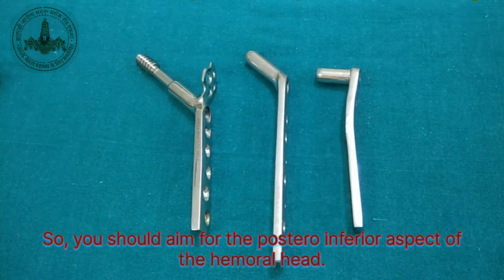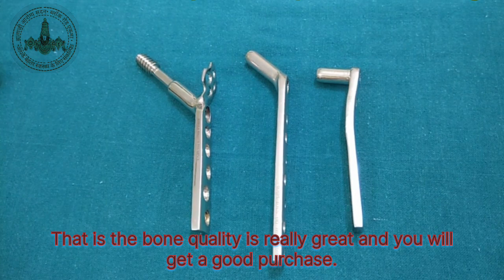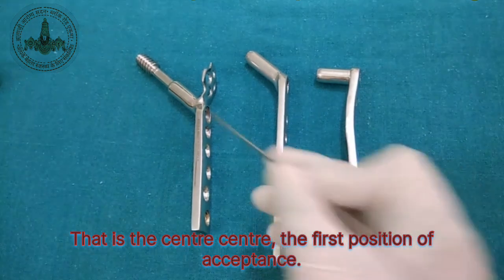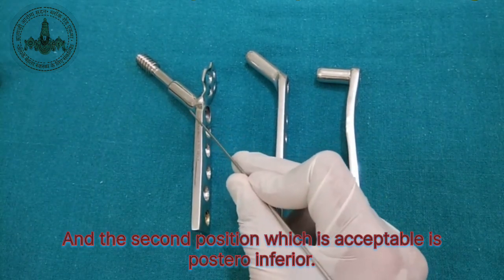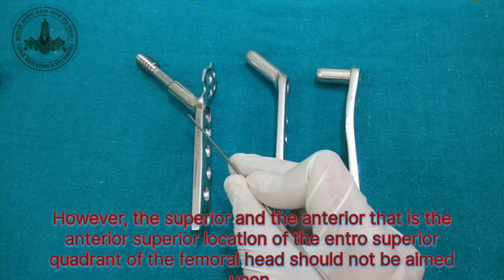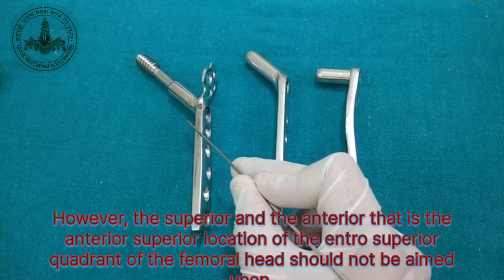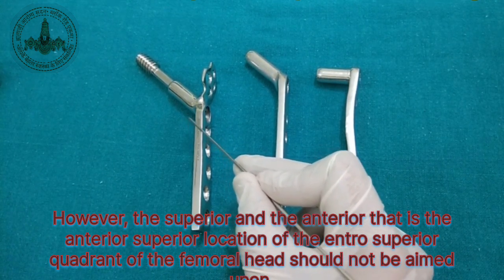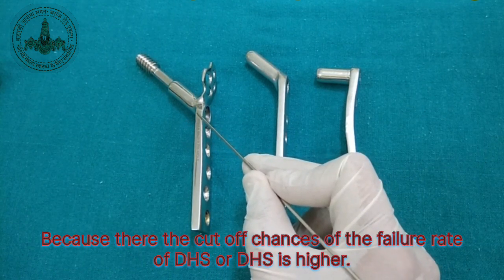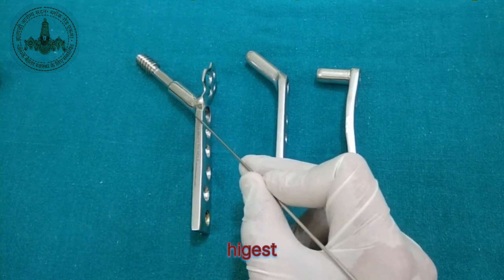So you should aim for the posterior-inferior aspect of the femoral head, where the bone quality is very good and you will get good purchase. So center is the first position of acceptance, and the second acceptable position is posterior-inferior. However, the anterior-superior quadrant of the femoral head should not be aimed at, because there the cutout chances, the failure rate of DHS or DCS, are highest.